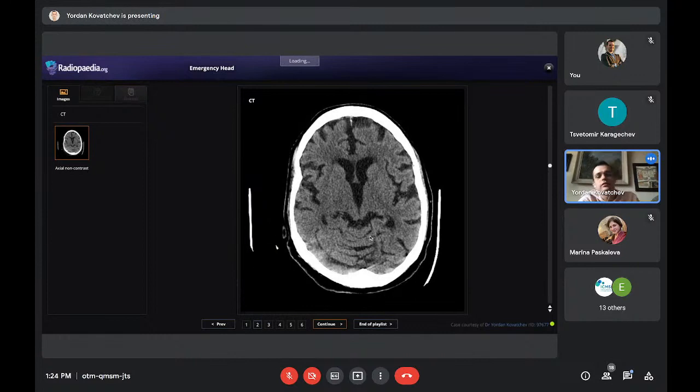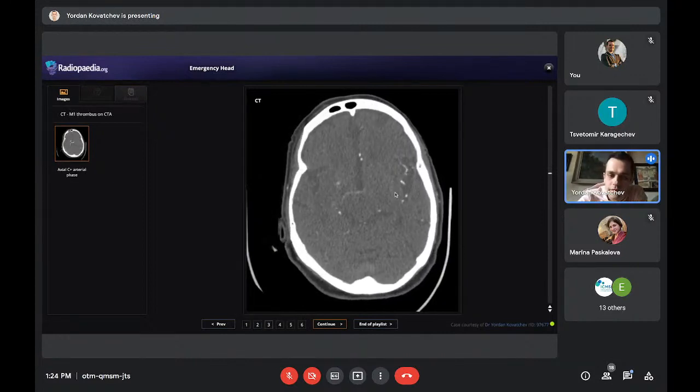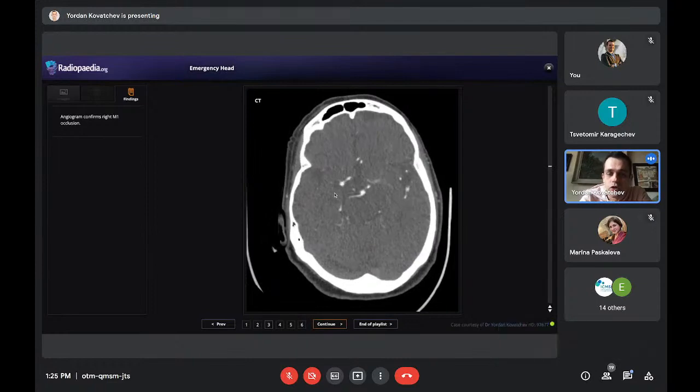And what happened is, for this woman, there are many factors that go into the decision, but they did intravenous thrombolysis, and they also did mechanical thrombectomy. For whoever doesn't know what this is, they went with a stent and a catheter to the brain, and they actually retrieved the clot. It's called clot retrieval. They got this clot mechanically and just took it out. It was pretty big. They took it out because she was within the first 6 hours. She had good catheterization, good access.